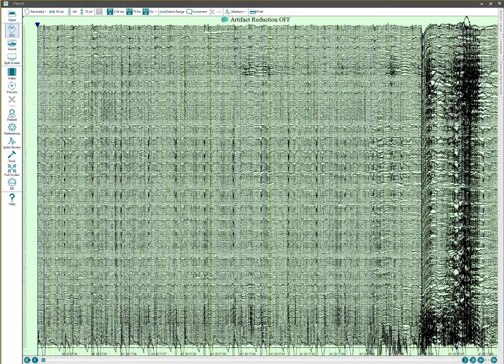Hello, this is an ad hoc screencast just to go over looking at channel maps for the EGI 256 channel recordings. Applies in many ways to other 256 channel recordings, but this is specific to EGI channel maps and variations that we have seen in some of those channel assignments.